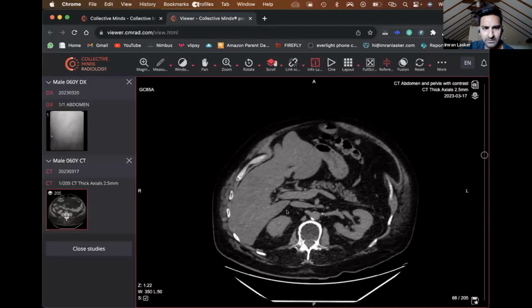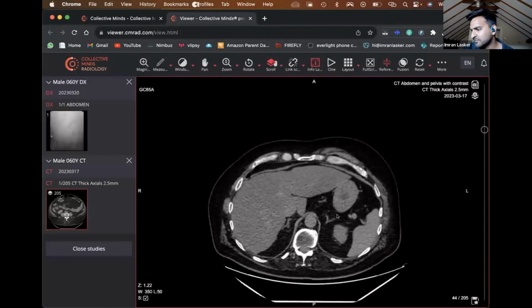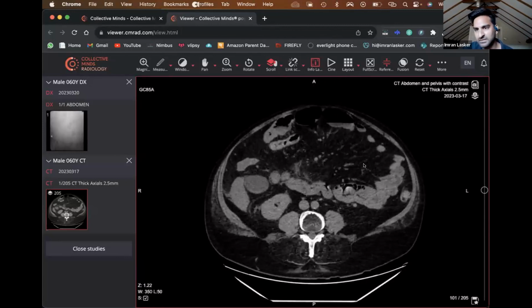Feel free to put your answers down. Yeah, exactly. So then you're looking at the adrenal glands, and then you're looking at the kidneys as well. A few people have gone for something weird, which is actually kind of true. It's not entirely straightforward, and only becomes more straightforward as you go to the CT scan.